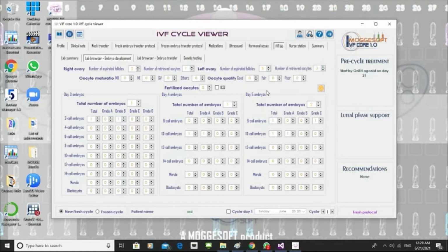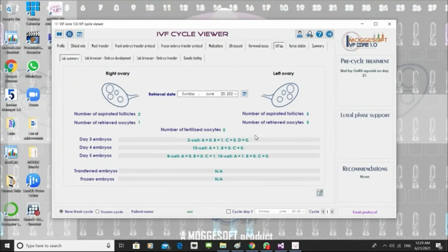And then once I'm done with that, I can click here. And when I click here and check the summary, here we go. So you find these numbers going into this chart, which is very high yield, so it just tells you the very condensed information that you need.